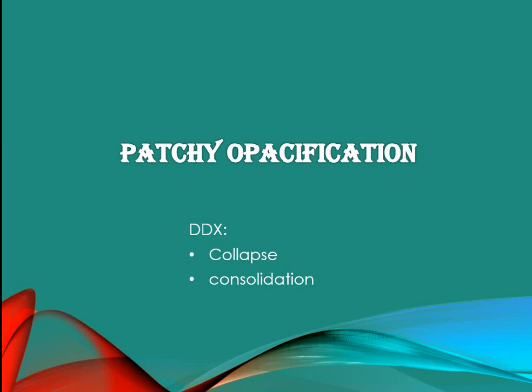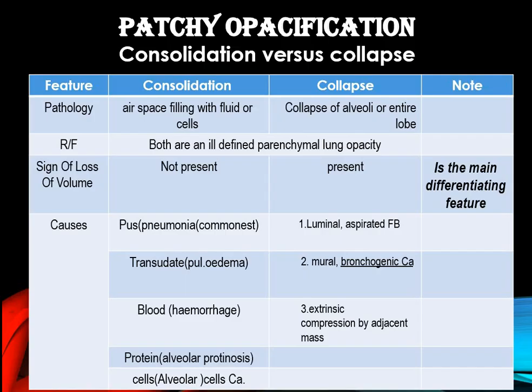Patchy opacification, as we said, is an ill-defined opacity of any size. We have two differential diagnoses, collapse and consolidation. This table is showing the main difference between the two. Consolidation is an air space filling with fluid or cells.